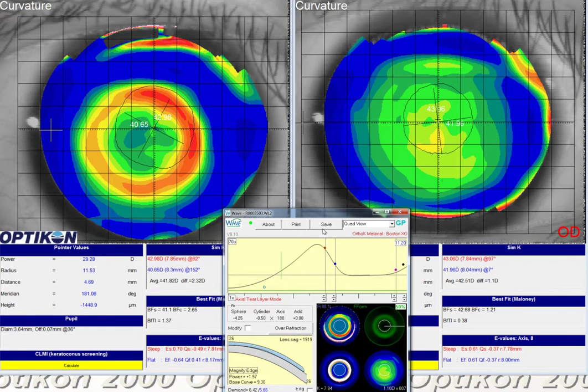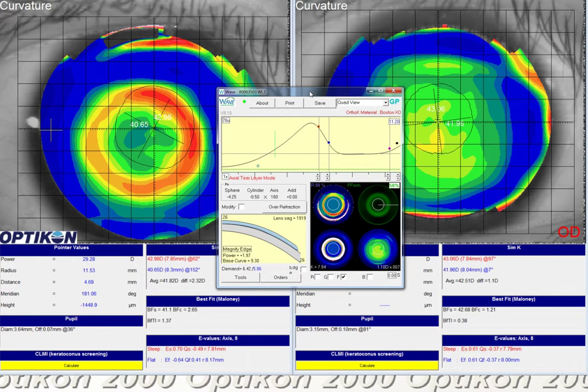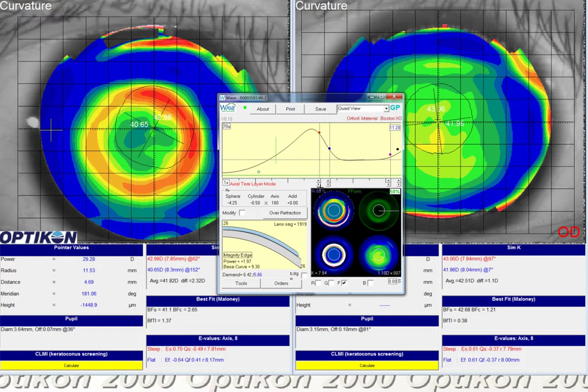If we create a difference map between the most recent and the baseline topography, you'll see that we're getting a peak flattening of almost 5 diopters right at the center, and that slowly decreases even within the treatment zone. But I think with that amount of shape change and a minus 4.50 or so refraction, your total power is probably okay. I don't think we necessarily have to increase that, even though the post-treatment refraction doesn't come out to a plano UDS, it does come out to a slightly mild minus UDS. I would just make the changes in the periphery to help address the induced cylinder.